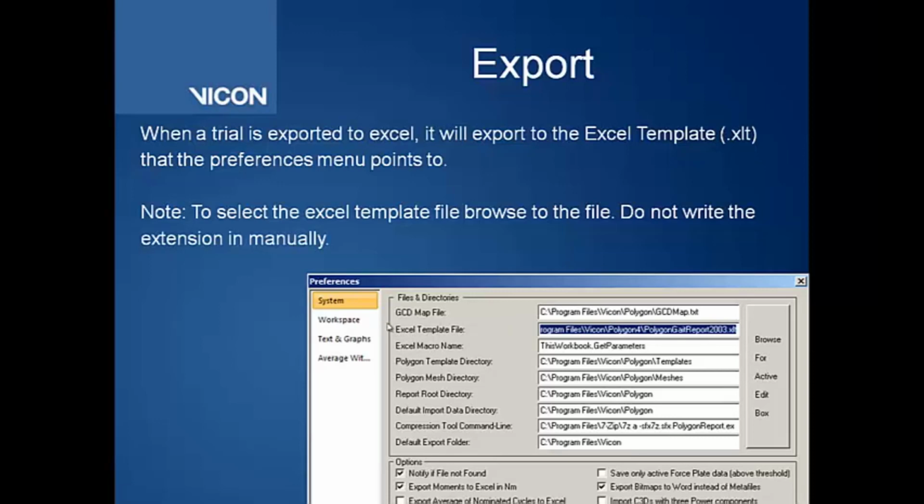Just a note, try not to write that extension in manually. Just go ahead and browse to it. It'll make life a little bit easier.